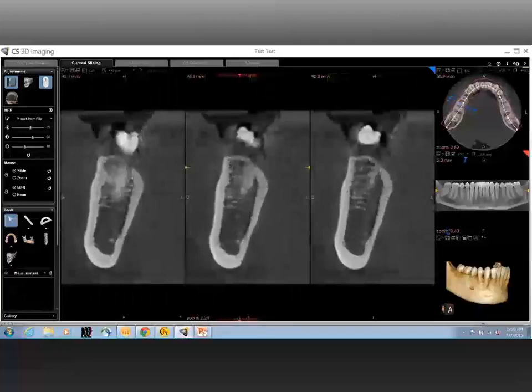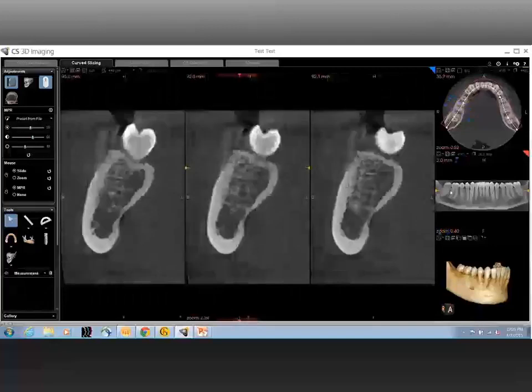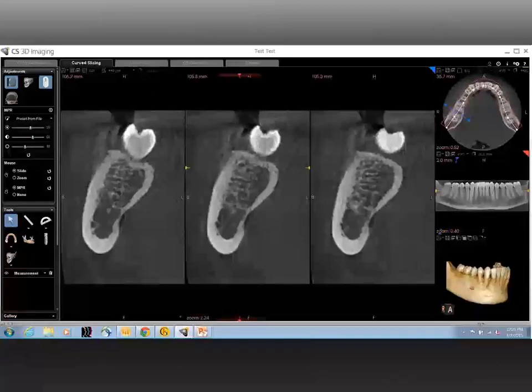If you look over there and see how the crestal bone is not exactly in a linear plane. It is curved, and that could easily change as you move from one slice to another or from one location to another. And you also need to know that area to be able to identify how much length and breadth of the implant is to be placed in that particular region.